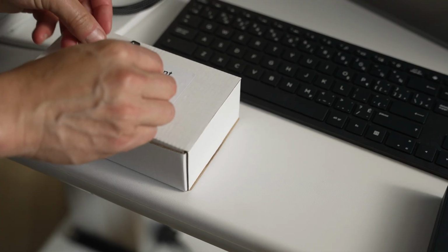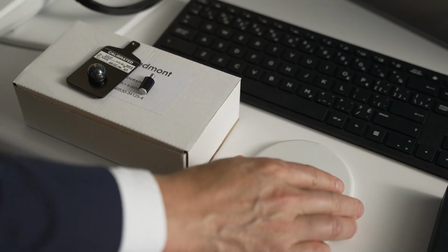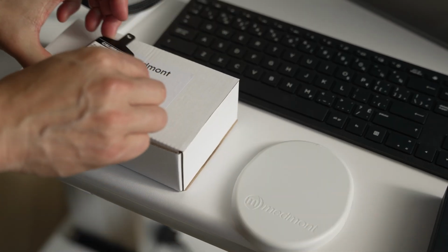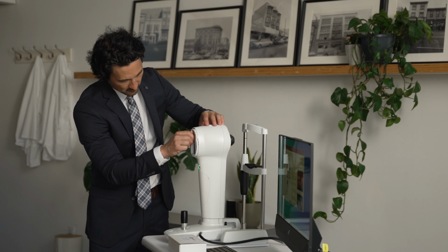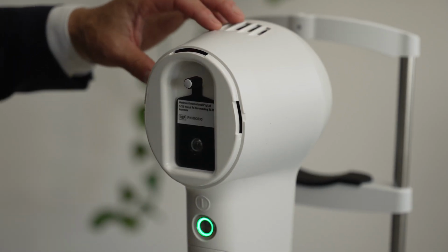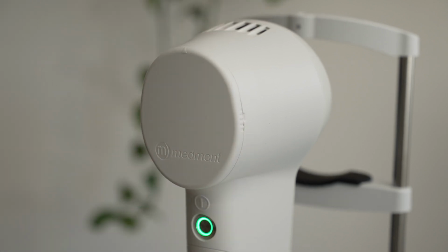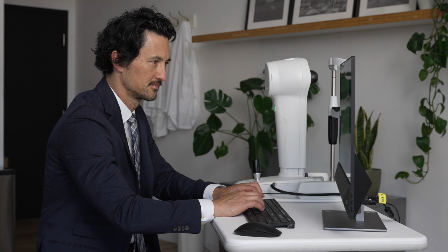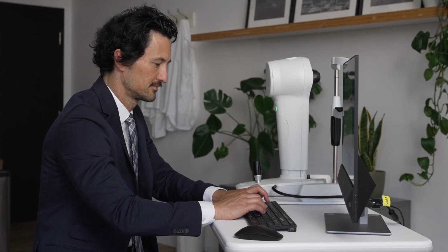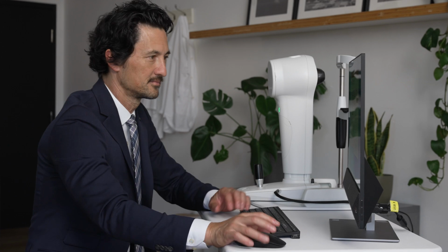You have the ability to store the calibration assembly in the back of the head of the Medmont Meridia. To do this, pull off the cover on the back of the Medmont Meridia. The calibration ball can be screwed into the threaded slot. When this is finished, you can reattach the calibration ball storage cover and you are ready to use the Medmont Meridia. Now that your software is installed and your Medmont Meridia is calibrated, you can start to explore the multifunctionality of your new Medmont Meridia.